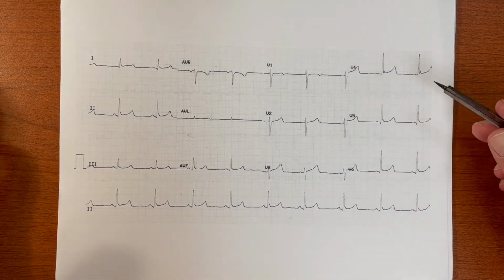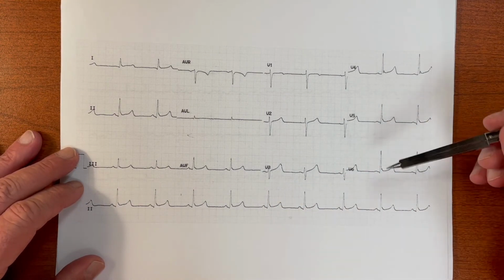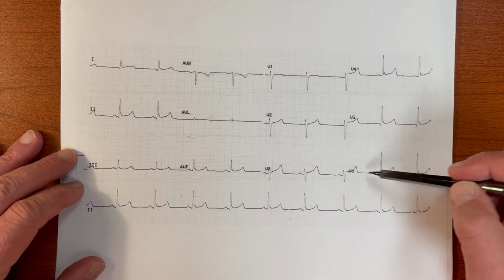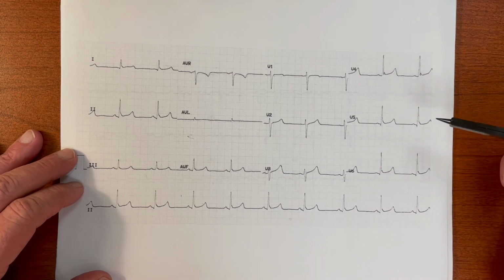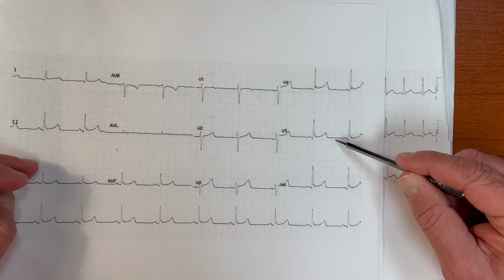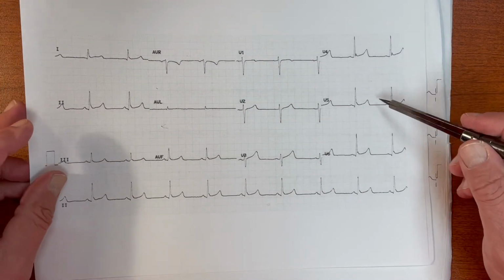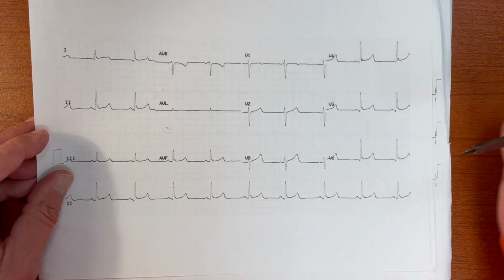Here is early repolarization. Okay, the patient isn't tachycardic, implying that they're comfortable. We see mild concave ST segment elevation with a J point elevation. Notice when we look at this EKG, early repol versus pericarditis, notice that the T wave looks relatively robust in early repol.